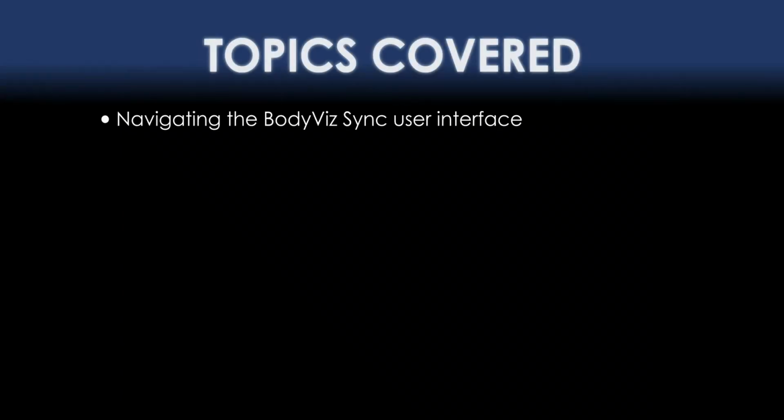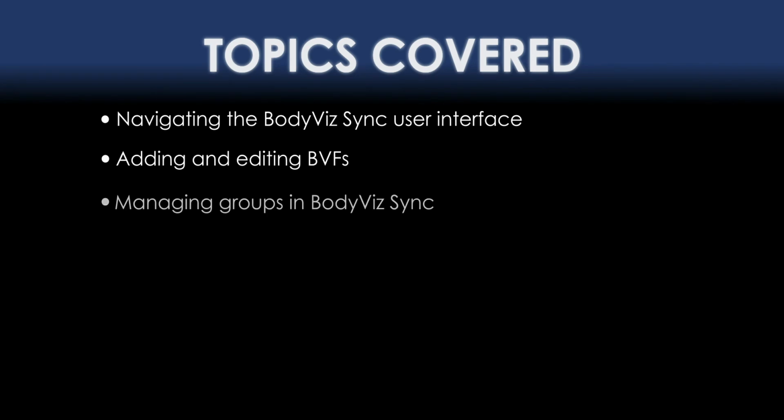The topics covered in this video were the BodyViz Sync user interface, adding and editing BVFs in Sync, managing groups in Sync, and uploading to the BodyViz cloud.